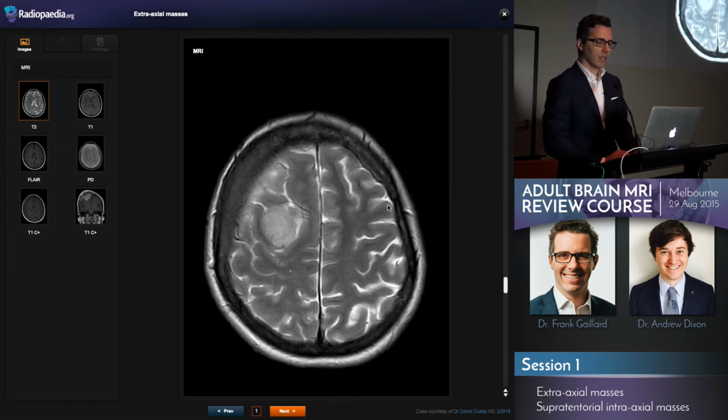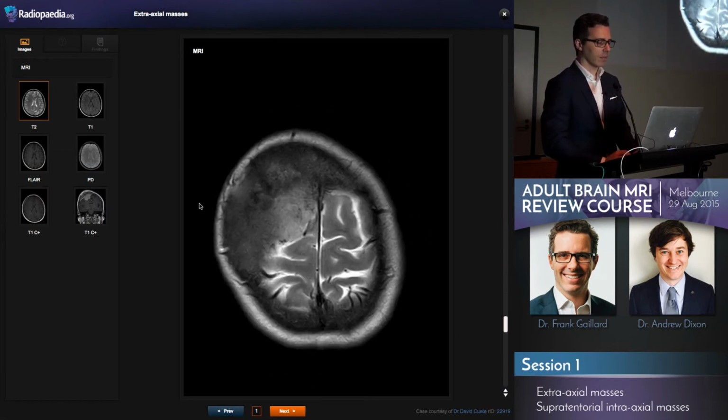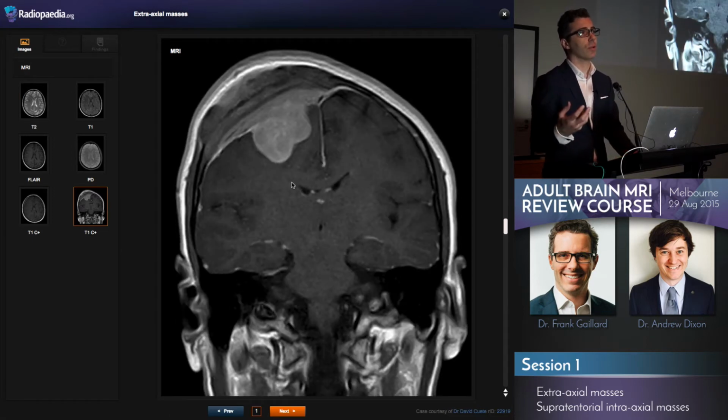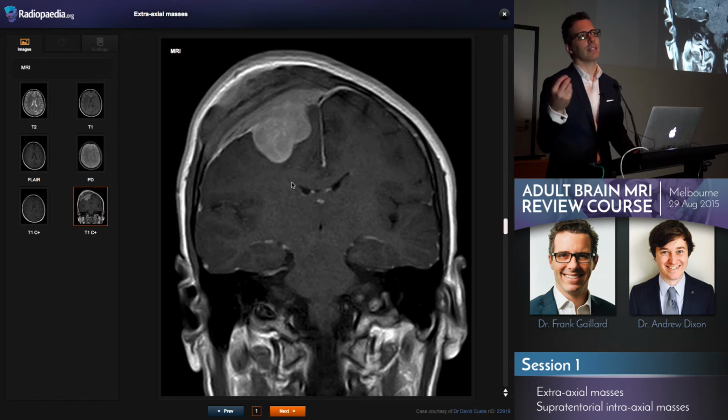So meningiomas sometimes, though, don't look all that quiescent, and they can go through bone. Sometimes they can be entirely intraosseous and just appear as an expanded enhancing region of sclerotic bone. But occasionally they go through. But one of the things that meningiomas tend to do is they go through, leaving behind a ghost of what structures they've transgressed.